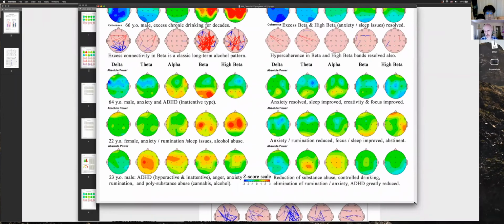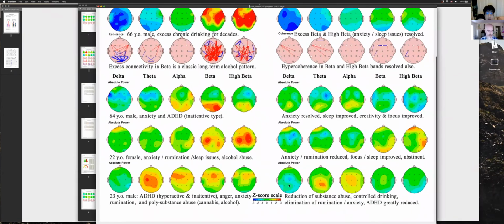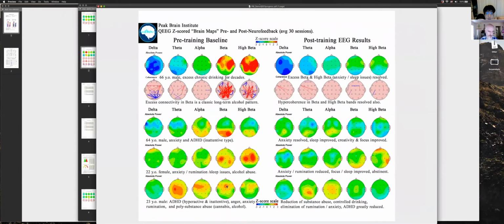You know, the cingulates we mentioned? This guy has classic OCD. That's the front midline. He has real classic OCD. You had a little hint of that, but not like this. Okay, this is classic ADHD. Okay, this is like a mood thing with an alpha stripe that has some focus issues. You have some of this as well.